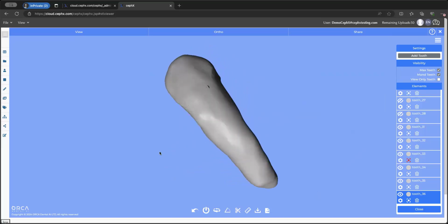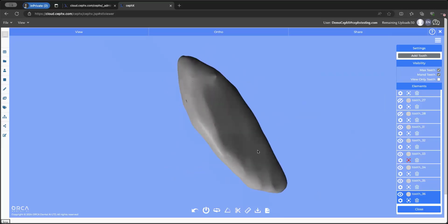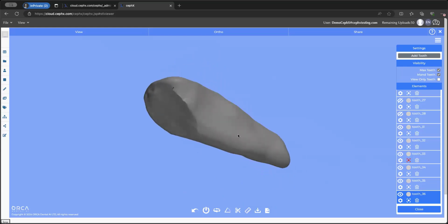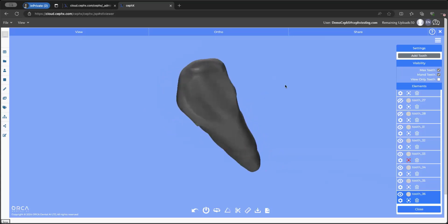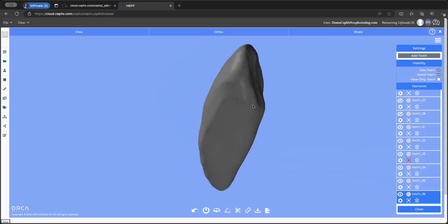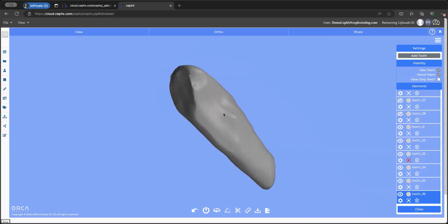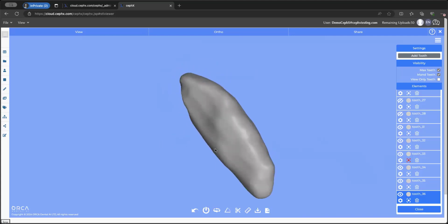And then the rest is the segmented root, which is naturally much less accurate just because CBCT has about half a millimeter, a quarter of a millimeter, or rather several hundred microns in accuracy. But you get a very accurate picture of what's going on because we've stitched the two together, and now you have a full representation of what's going on within the patient. So that's a very important section, and we're building more and more tools based on that.